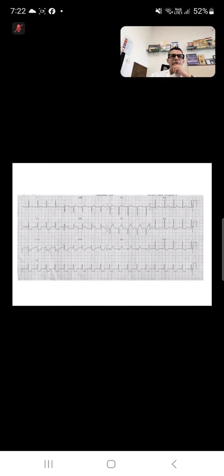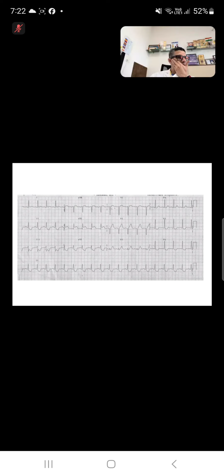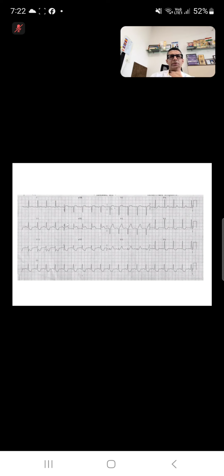So you look at the duration of the QRS complex and the morphology of the QRS complex. So is the duration normal? Narrow to normal. There won't be anything like narrow QRS. It's either normal or broad. There won't be any condition which will narrow the QRS further. So the duration is normal. Amplitude and all is normal.